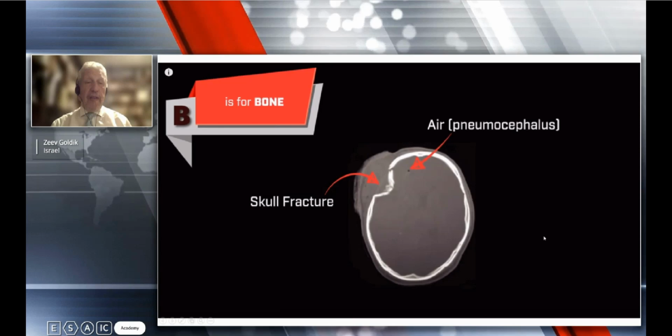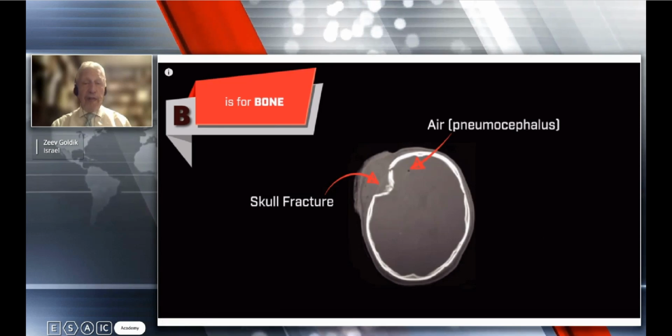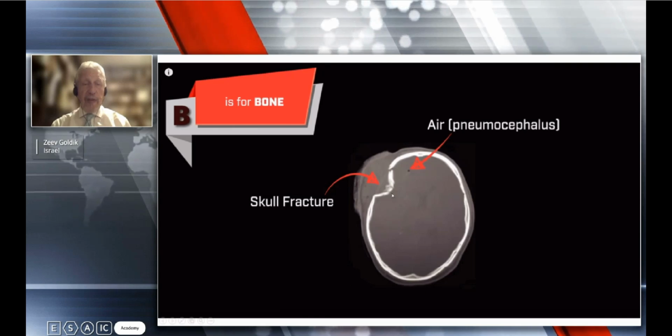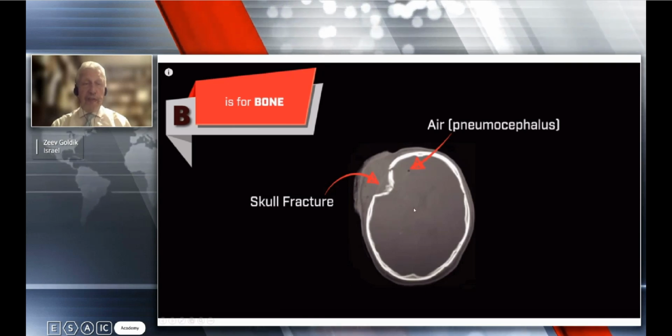So we have to look whether the skull is in a good situation. Here we can see a skull fracture, for instance.